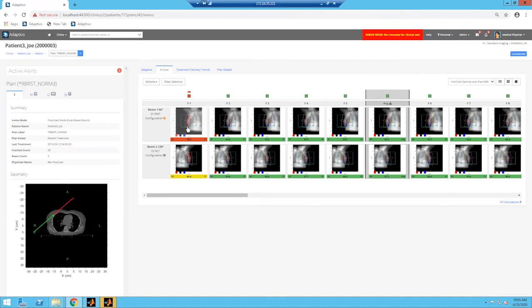Areas in red indicate areas where the measured dose is higher than the predicted signal, and the areas in blue indicate regions that are lower than the predicted signal. So for fraction 1, we're actually outside of the tolerance of the gamma criteria configured in the software for the medial and lateral tangents, but all the subsequent fractions are passing within limits.